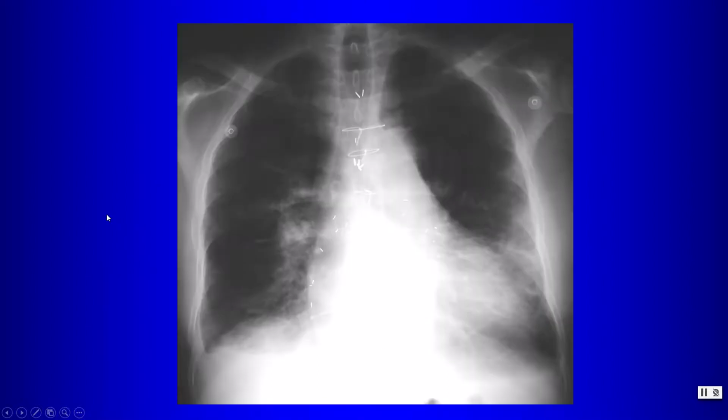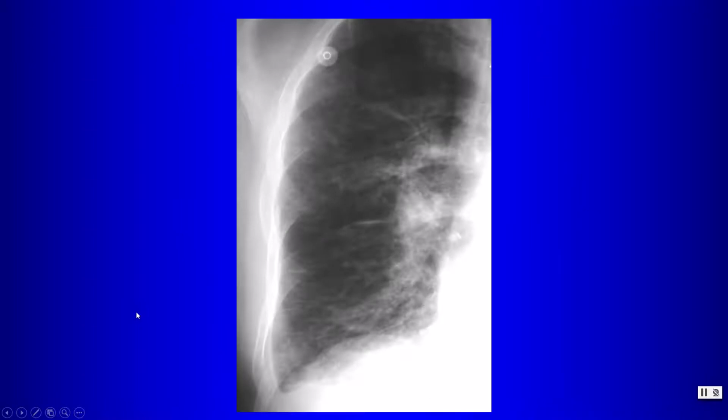And so here's an example of interstitial edema in somebody with Kerley B lines. We can see these lines here in the periphery, and this patient also has a small pleural effusion, which we can see here on the right also. Here's a close-up of that case, showing again a nice demonstration of the Kerley B lines in the periphery. In this patient with a right effusion, we can see some interstitial thickening, also radiating out from the hila.